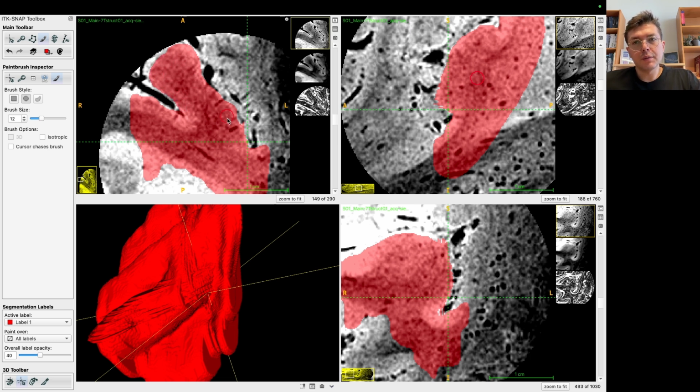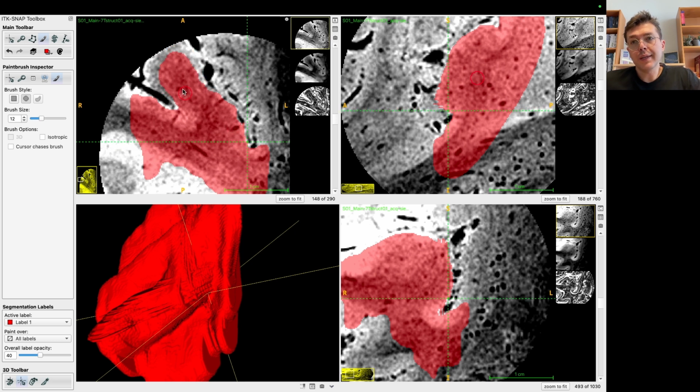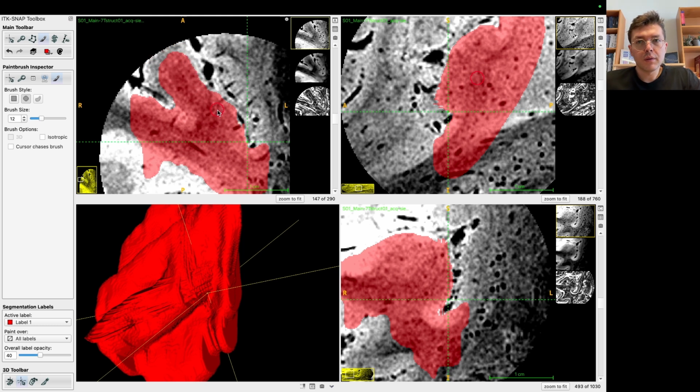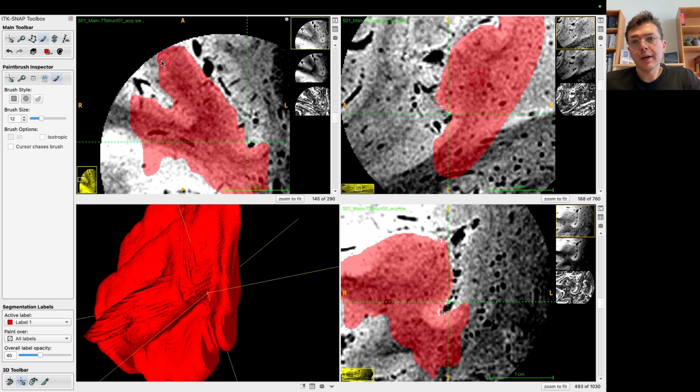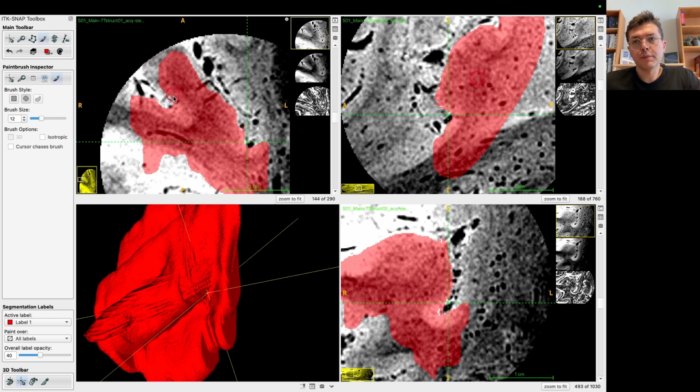Many people don't understand it, but also, many people don't do this type of high precision work in one region of interest, as I've been doing for my whole career, basically. So what do they know? For whole brain stuff, of course, we cannot do it for the whole brain. That's clear. If you want to do fancy whole brain laminar analysis, you cannot do this. It will just take too much time. There are other methods that I use for that to polish more quickly for the whole brain, but this is now good enough for what we want to do.